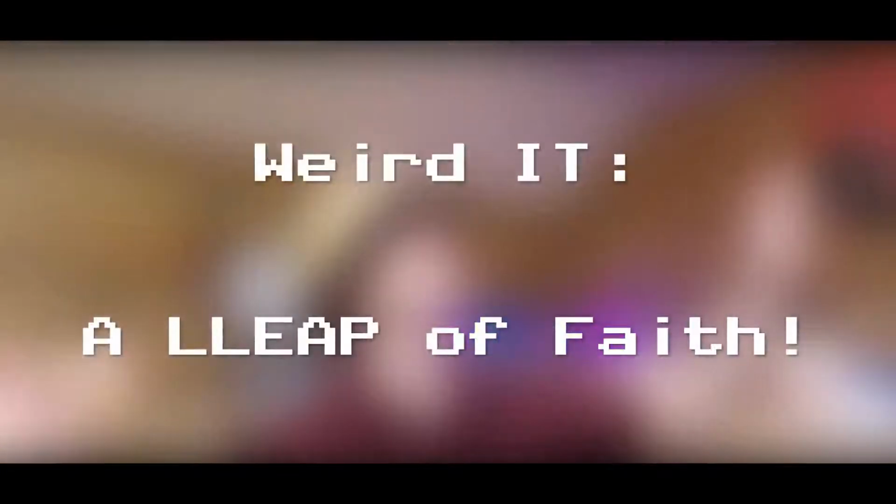Hey there, hackers. Are you ready to go on a journey in simulation healthcare technologies? Can it work? Does it work? Is the technology truly what it seems?